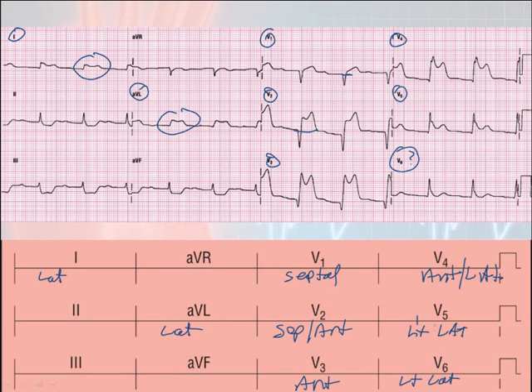The next question is, how do you document something like this? How do you document that the person is having all of this going on? It kind of depends. I've read a couple different things. You're supposed to do it alphabetically, or you do it by the most elevation somewhere. I haven't found it. If anyone finds out the real answer, please let me know so I can make sure I put that out in information.